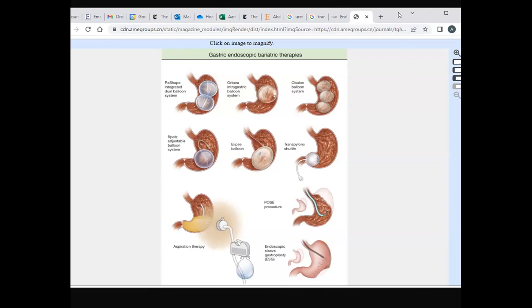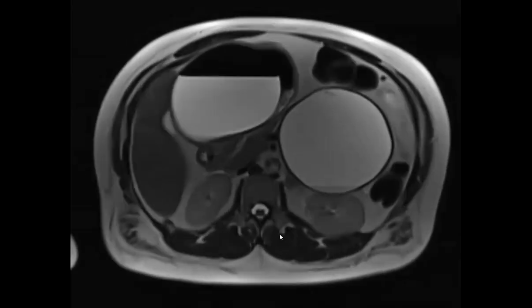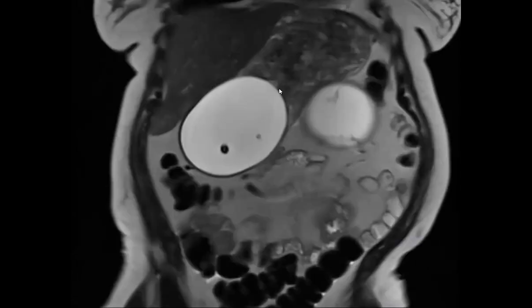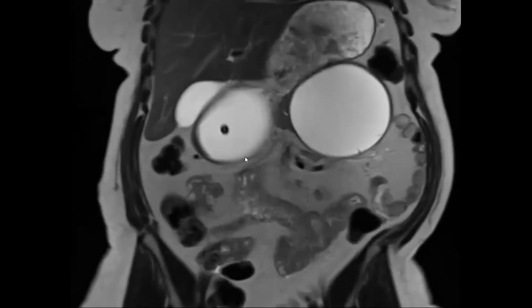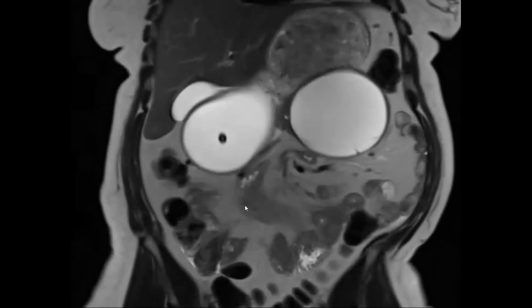We have a trial going on where we put the gastric balloon, like the middle one that you were showing in the picture, and we do ultrasounds to document the position every several weeks. Oh, wow. Cool. Obviously it seems to be working since there's a lot of debris in the stomach, and it does look like the catheter tubing is going into the duodenum part. So it's in the proper location that they wanted it to be.